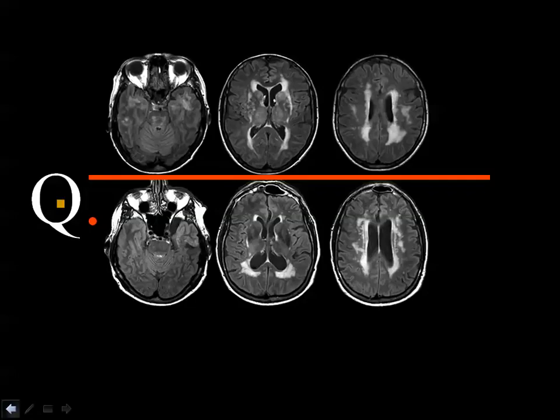Yes, and this is subcortical arteriosclerotic encephalopathy in this patient, and this one, if you look carefully, you see the temporal lobes are affected in this patient, they are not affected in this patient.